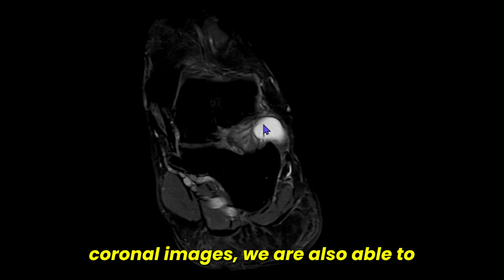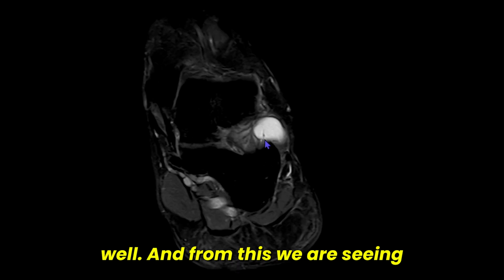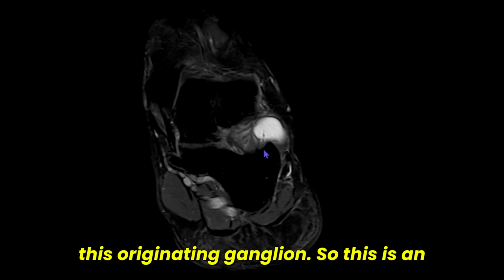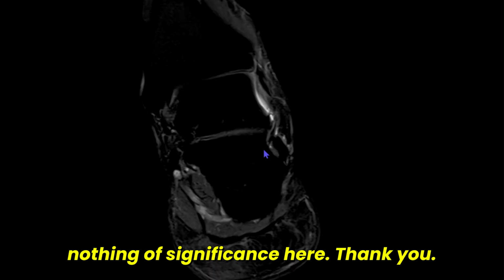And on the coronal images, we are also able to see this sinus tarsi region very well, and from this we are seeing this originating ganglion. So this is another, just an incidental finding, nothing of significance here.